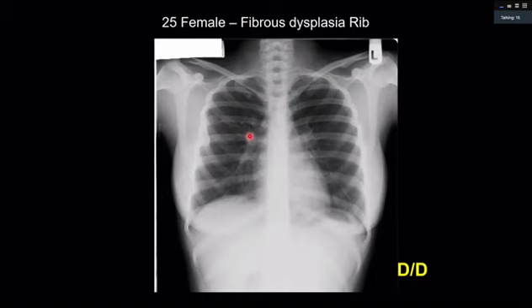So as I mentioned, there's bony expansion, but it has well-defined borders. And actually it looks predominantly sclerotic, but I think partly that's due to the fact that it's en face to the X-ray beam. It's difficult to describe its internal matrix, although it looks quite uniform. Right. Oh no, sorry, I'm looking at the wrong thing. Okay, no, so it looks lytic. It looks lytic with thinned cortices, well-defined borders, no bony destruction, and mild expansion.